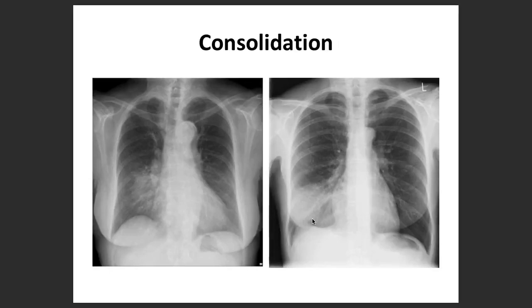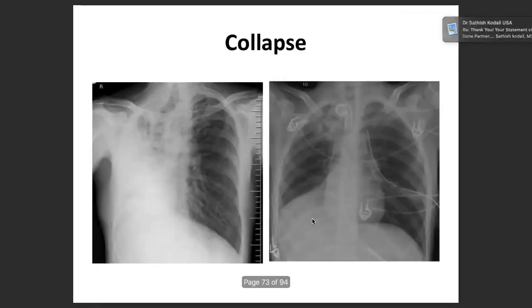For example, a child comes and the mother complains that the boy sniffed in some dust or some solid stuff. That is what you may notice over here, and of course it corresponds to the different lung fields. Wonderful.